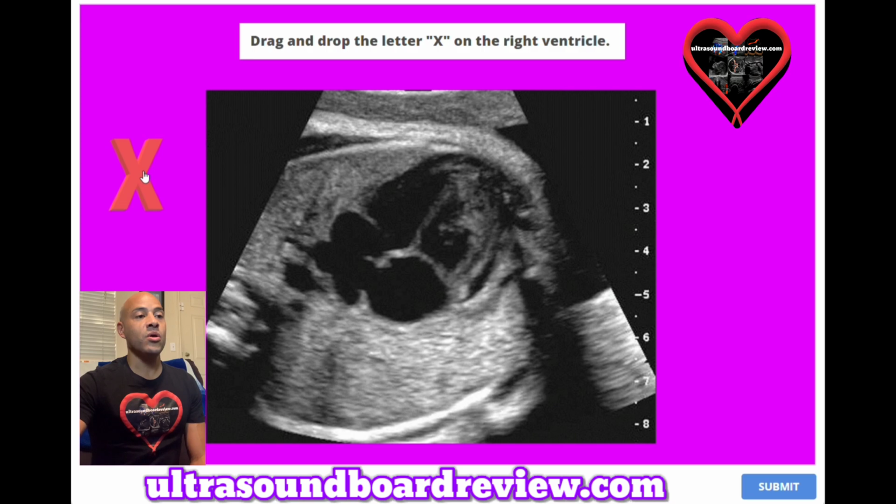The answer is right here. You can see the prominent moderator band here, which is a thicker myocardium. So we'll just put this X right there. That's the right ventricle.